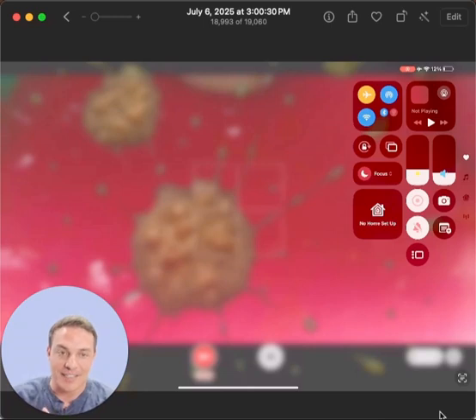So very early. This is not for use in humans. I want to stress that point. This is set for mannequins. It's trained for a specific mannequin. At this point, this does not translate out to any mannequin. This is not available to the public, but we are running these tests internally with a couple of partners.